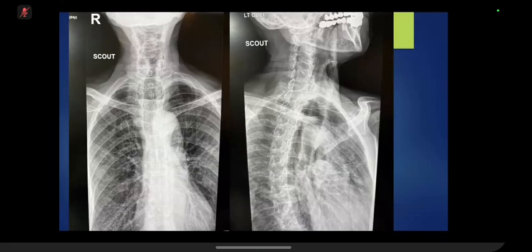Okay. Or any other finding? There is some radiodense opacity seen here, but I cannot appreciate any corresponding opacity on the frontal radiograph. Bilateral apices clear. Lateral radiograph.